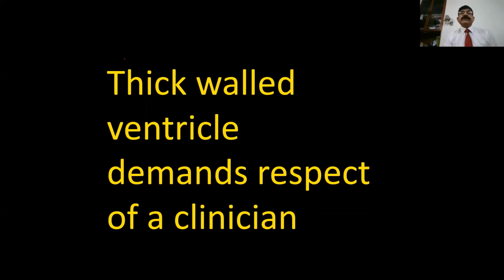GLS typically in hypertrophic cardiomyopathy is closer to 10%, 10, 11, 9%. In hypertension, it is more like 15%, normally about 20%. Paradoxical strain, which means septum or sometimes the other wall showing systolic stretching or lengthening or positive strain, is highly specific according to Jerome Bex, although we have seen it in other conditions also, but its sensitivity is about 54%.